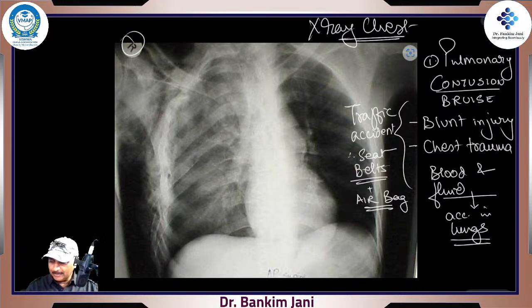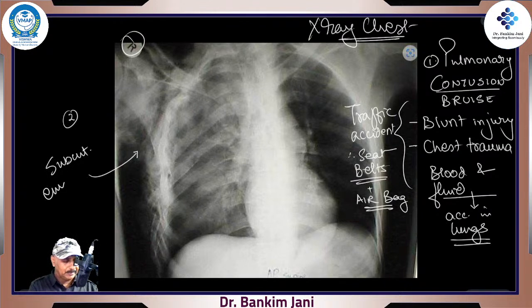Now we come to something which is very, very serious. By the way, this is one point. This second, you can just judge by yourself, right? Can you see this? See this side of soft tissue completely black, and in between you get all these irregular margins in the soft tissue. It is subcutaneous emphysema, right? So from this look itself, you are almost certain that this is a case of accident.